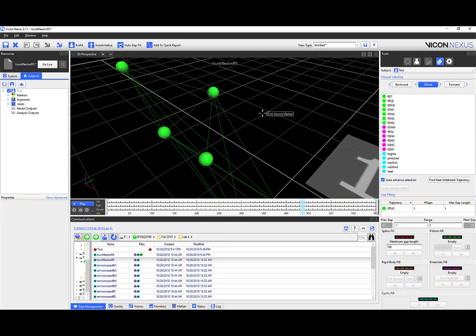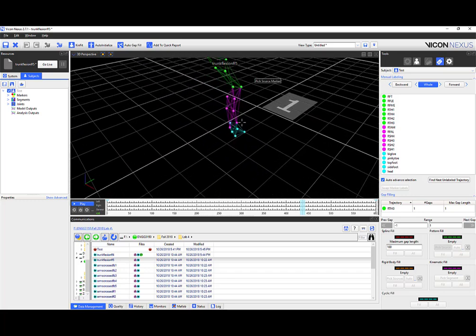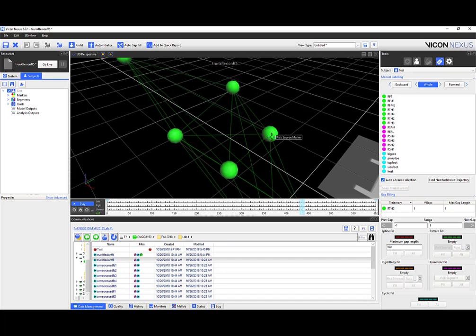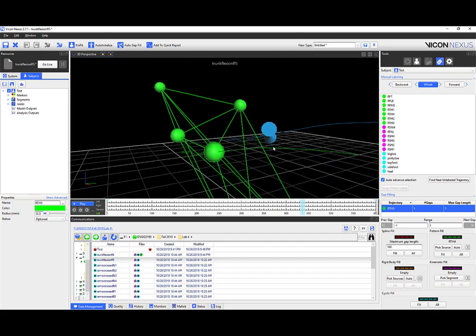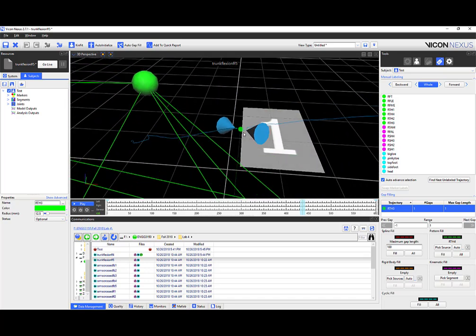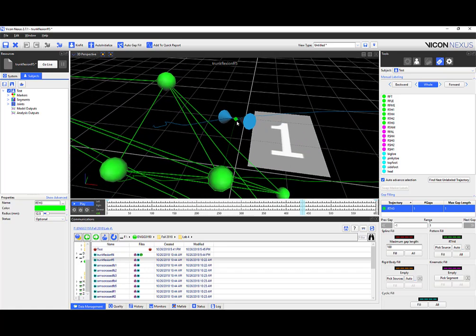Pick source. And again, if this marker is going missing here, you don't want to be using a donor down way here. No, you want to use a donor that's closest to it, because they have a better idea of where this guy is based on what they know of it in the past and in the future, right? So our donor, I'm gonna go ahead with this one. So it maps out, you can see the blue line right here. It maps out, actually, there it is, that tiny green dashed line. It maps out where that marker will be if you were to choose that.